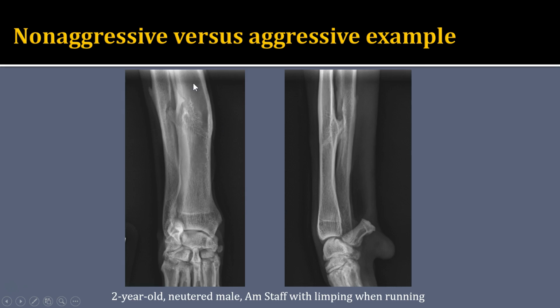Here's an example of a patient where we're looking at the distal mid through distal antebrachium. And when I look at this patient in this distal diaphysis of the radius and the ulna, so two lesions, so the previous one was monostotic, but this is polyostotic, I see that there is coarse trabeculation and maybe in the radius here some geographic lysis, but lucent area. However, with the coarse trabeculation, there's no cortical lysis. It's affecting two bones in the same area. There is some very solid periosteal reaction and a very distinct transition zone. Normal bone into the lesion, back into normal bone.